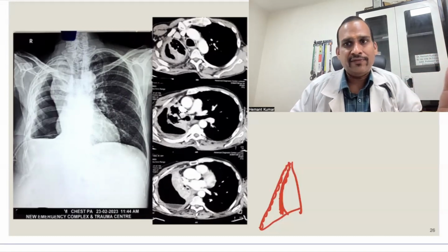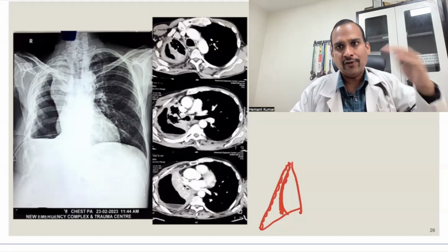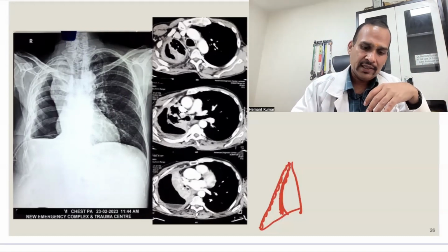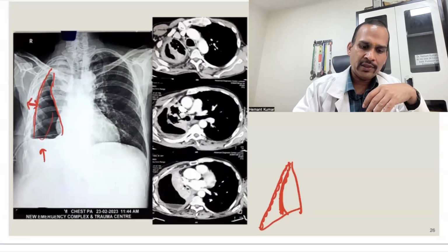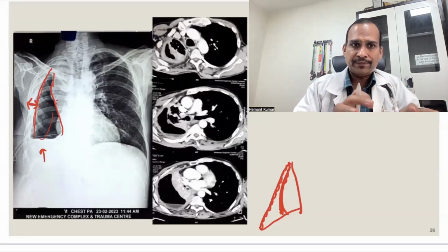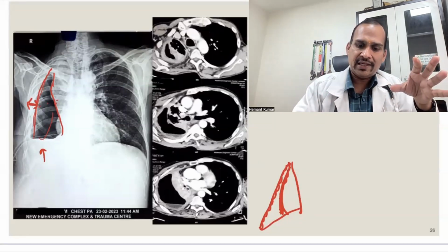Patient will require decortication, the peeling of pleura, which is a different issue. So in this X-ray, you find there is pneumothorax here and this is effusion, and you can see this is the pleural border. This is visceral pleura, this is parietal pleura. So both are thickened. For a complete explanation, you can get a CT scan done.